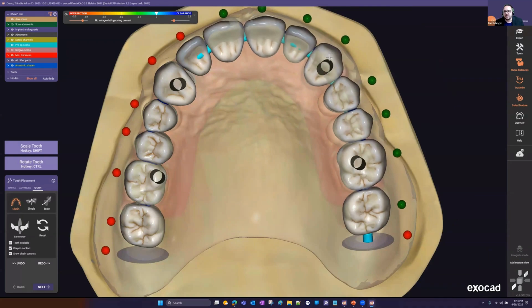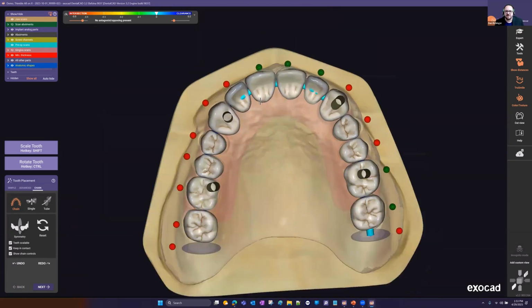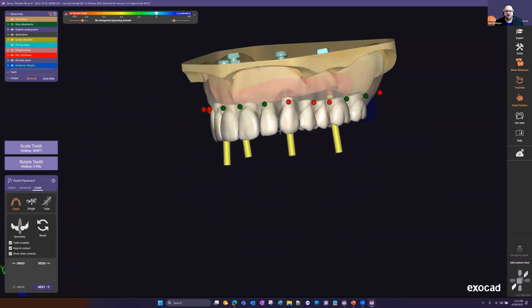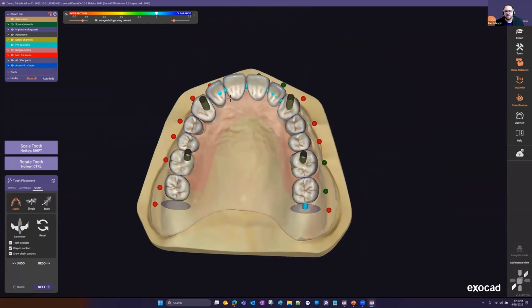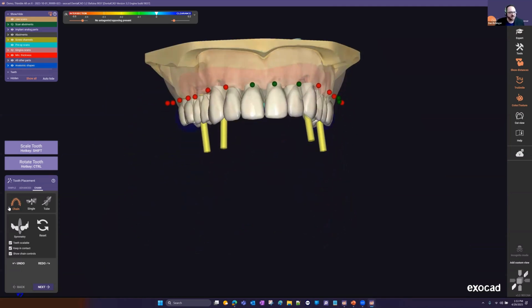I look at this as just a quick, easy way to trace things. So I'm just left clicking and dragging. I'm not even doing any hotkeys at this point. I might have used shift occasionally to scale some things, but I didn't really count how many clicks I did there. We'll say 10, but to be that close to the pre-op with little interaction, I don't know, for me, that's awesome.